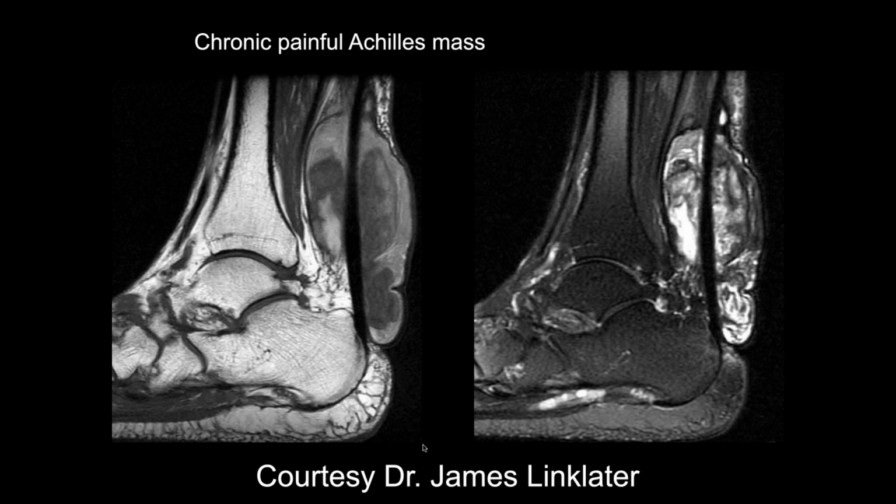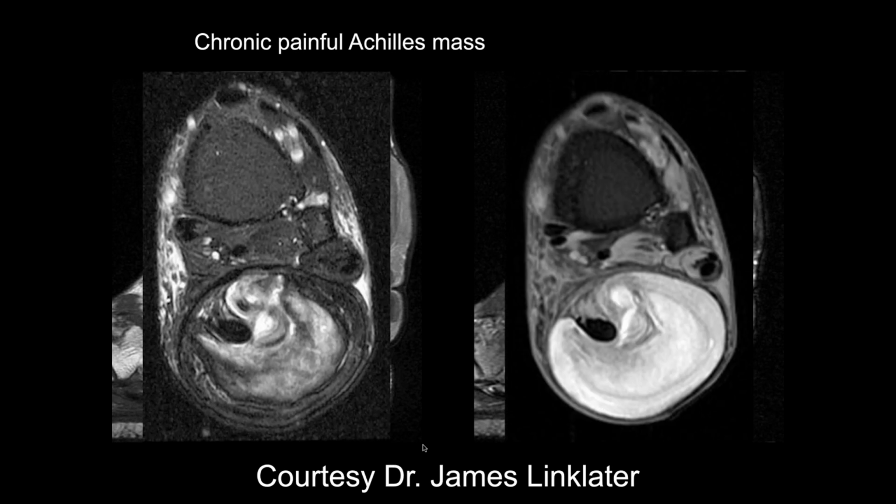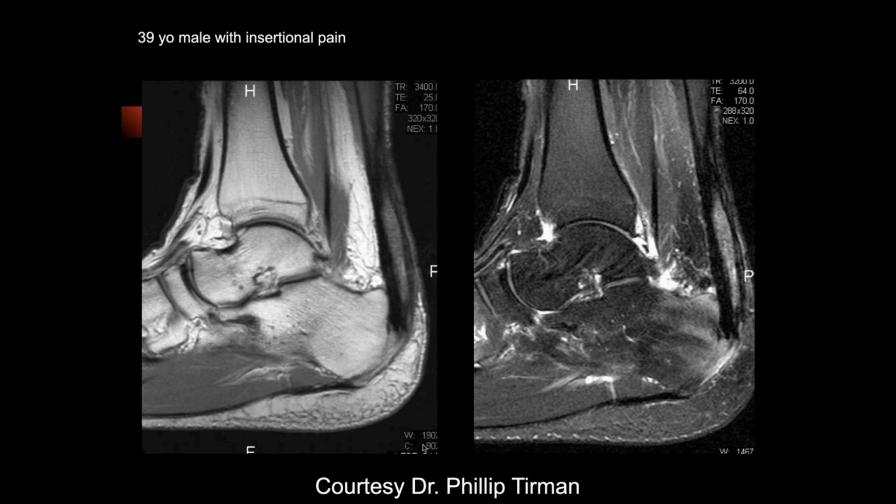Okay. Michael. Okay, so we have a huge heterogeneous mass or thing of synovial thickening surrounding this Achilles tendon, which could be a similar finding to the previous case, or similar pathology, I mean. Yeah, this is all gouty tendinopathy involving the Achilles. It's amazing to think that they can get that big.